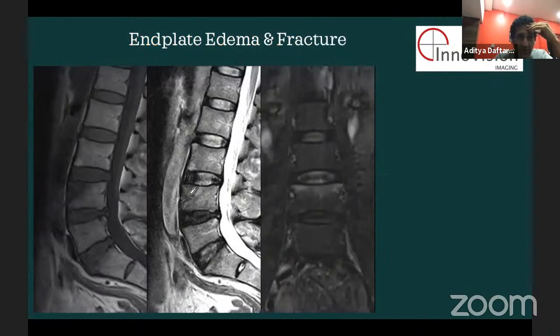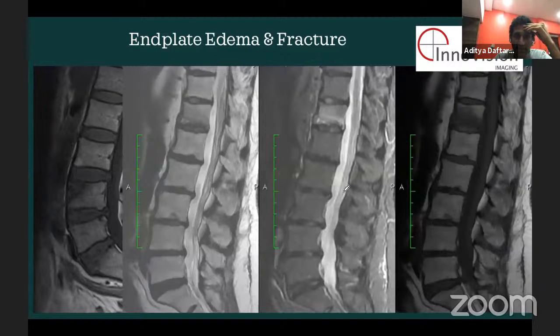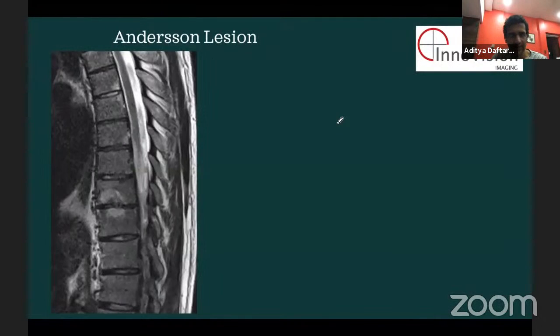You can see these kinds of conditions where sometimes you see bone edema, and you can see the edema is horizontal, fairly diffuse. And this is just an end plate stress fracture. So stress reaction or stress fracture at the end plate. Here you can see more inferior end plate stress reactions and stress fractures. These can become hard to differentiate from infection, or from just a stress reaction or degenerative change. If there's no collection, there's nothing else, these are the ones where you'll say, okay, let's not start anything, but let's just monitor this patient closely to see if they get better or worse, so that you prevent things from happening a little further down the line.